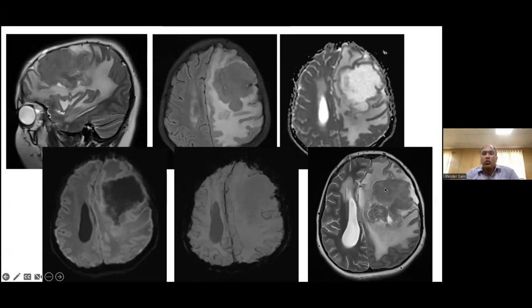So normally a T2 hypointensity in cases of mass lesions is indicative of high cellularity of the lesion, because more cells are there. They are mitotic lesions. And so when more cellularity is there, diffusion should be restricted. The fluid should not be. So here in the diffusion weighted image, it is opposite behavior. The lesion area is showing a behavior similar to the CSF.